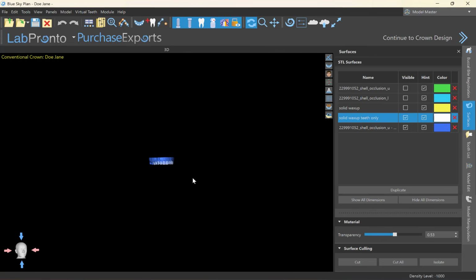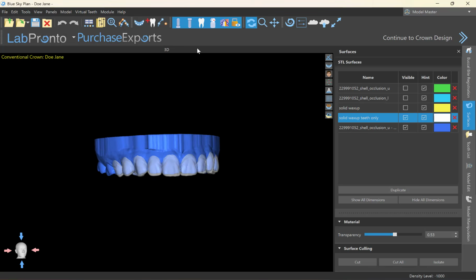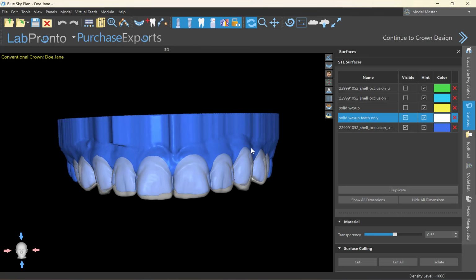Now, sorry, this mouse is going crazy. Now, the other reason why I like this is oftentimes if you are doing a gingival recontouring, you have to think about, is this a purely gingival contouring type case, or is it going to require some osseous recontouring?